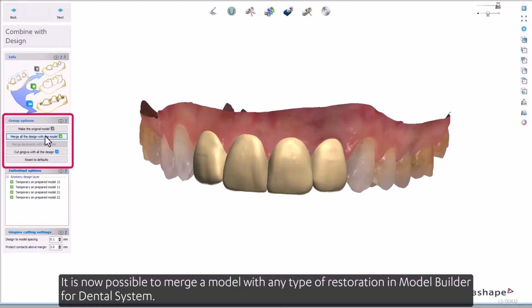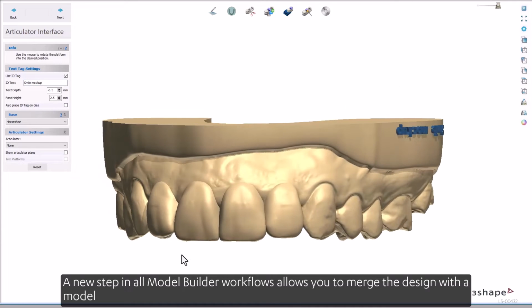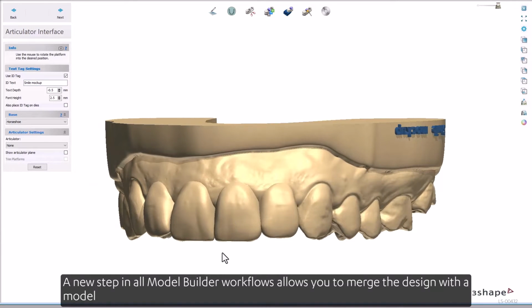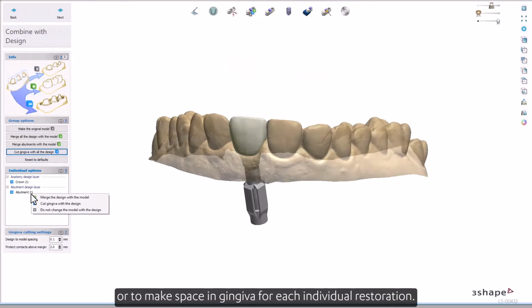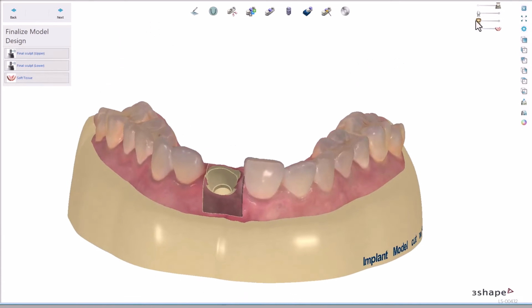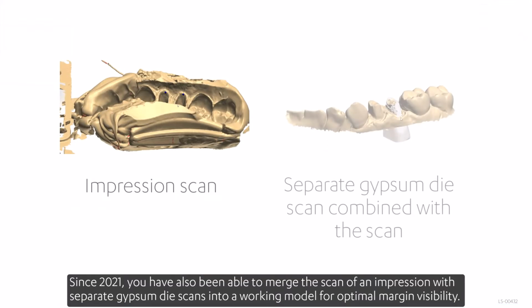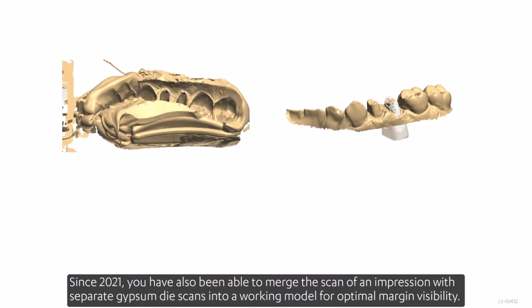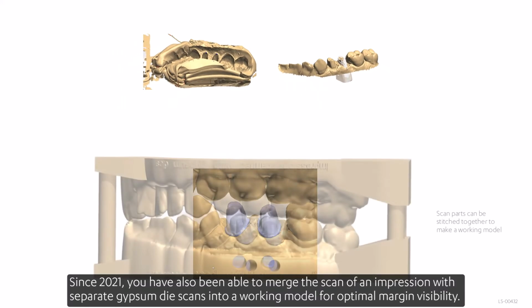It's now possible to merge a model with any type of restoration in Model Builder for Dental System. A new step in all Model Builder workflows allows you to merge the design with a model, or to make space in gingiva for each individual restoration. Since 2021, you've also been able to merge the scan of an impression with separate gypsum die scans into a working model for optimal margin visibility.